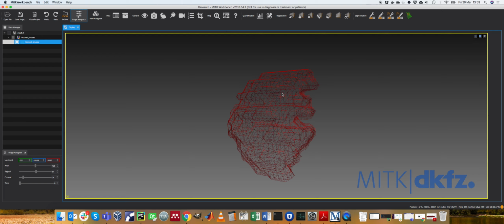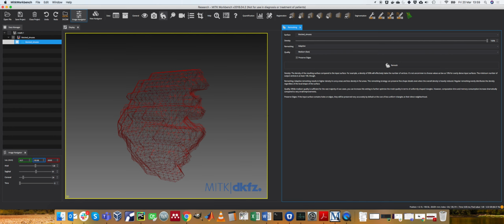So typically people do some kind of post-processing. One second, I've forgotten where the remeshing thing is. Ah yes, so here is a plugin. If I take this triangle mesh and I say let's reduce it down to 20% of its size, I press remesh and I get another mesh.